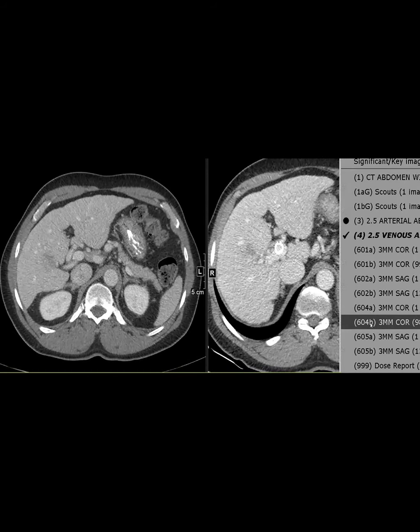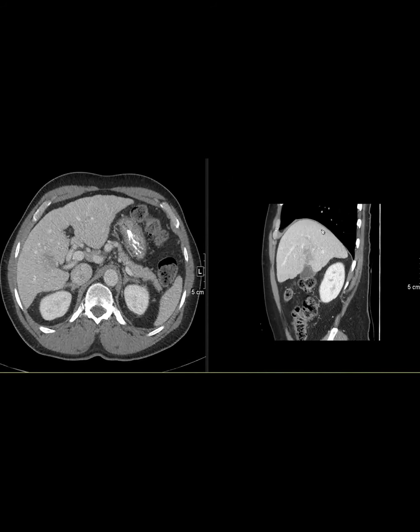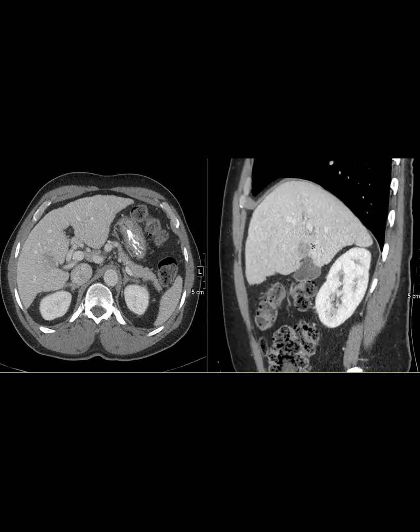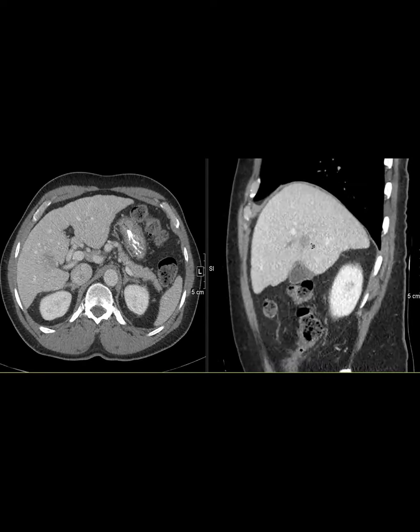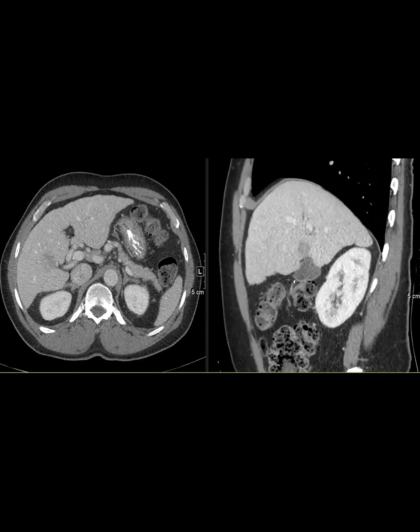And if you look at the sagittal, it's a little more convincing. Do you guys see it? Victoria, do you screen a lot of patients with CT? We usually only use CT if they can't get MR for some reason.